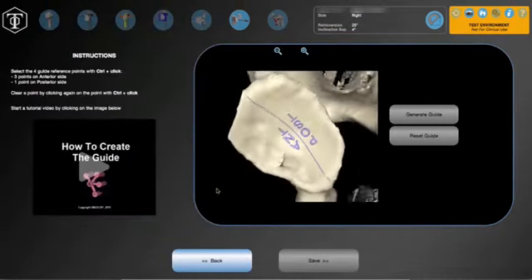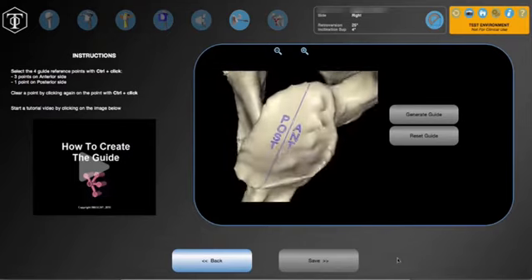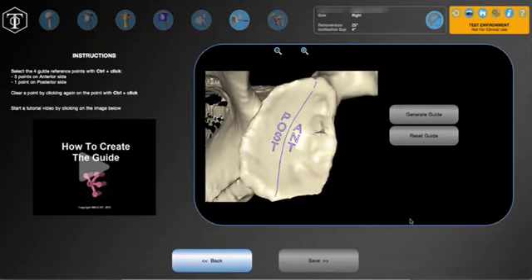So typically when I like to generate my guide, I think about very carefully where my retractors are going to be going, and this is very surgeon dependent. When I use a Fukuda retractor posteriorly and inferiorly, I know that one of the rungs of the Fukuda tends to sit right posteriorly and inferiorly on the glenoid. So I've learned, unfortunately the hard way, that this posterior peg tends to need to sit right underneath the scapular spine.